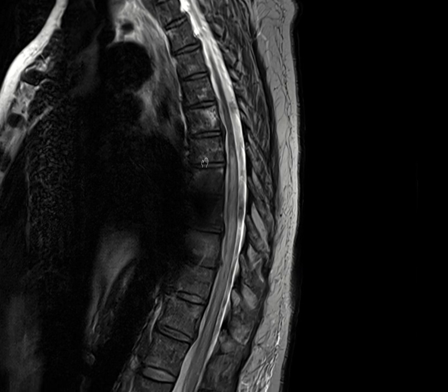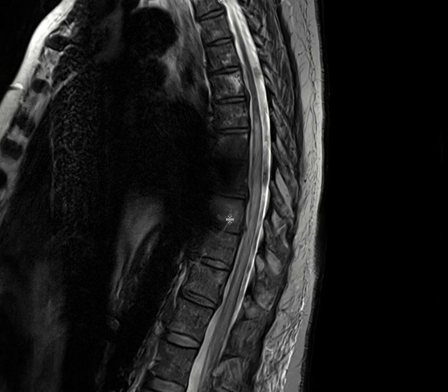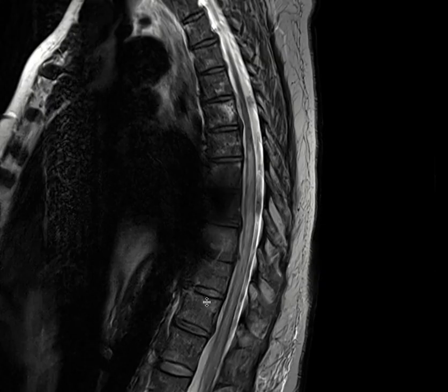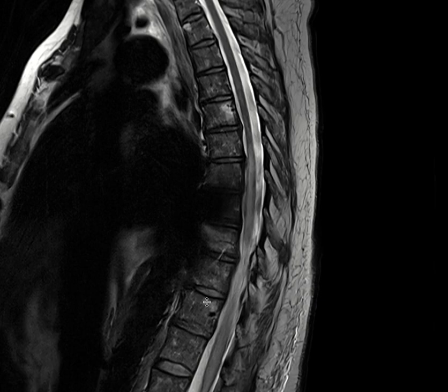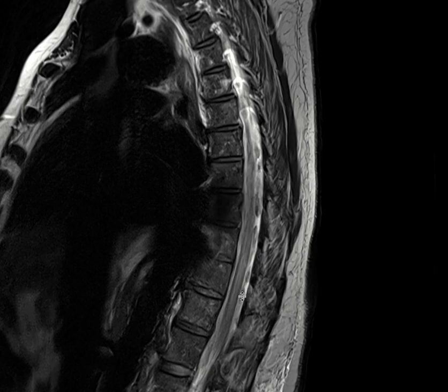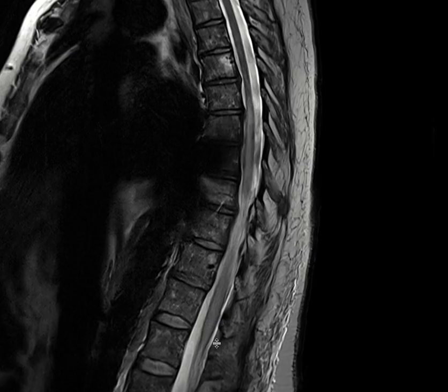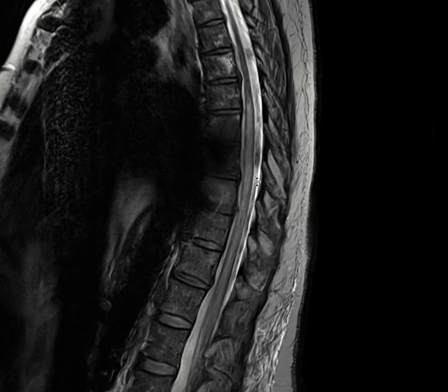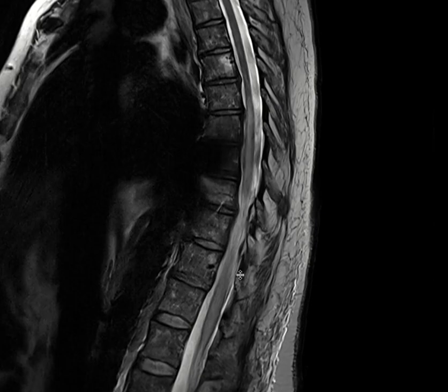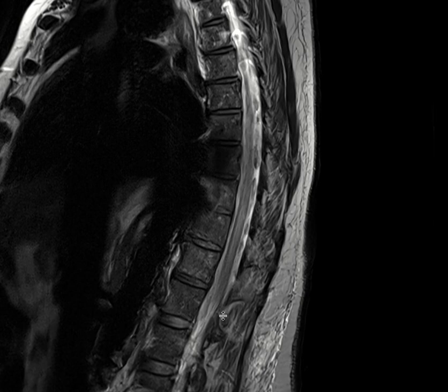So this is a patient in their 60s who came after a history of aortic dissection. The patient presented to the emergency department with paralysis of the extremities. When we did his MRI, this is a little bit motion-degraded, but if you look at this, the upper thoracic cord looks fine, but in the mid and lower thoracic cord, and also going all the way back to the conus, we see diffuse T2 hyperintensity throughout the cord. So the entire cord looks expanded and there is abnormal T2 signal.